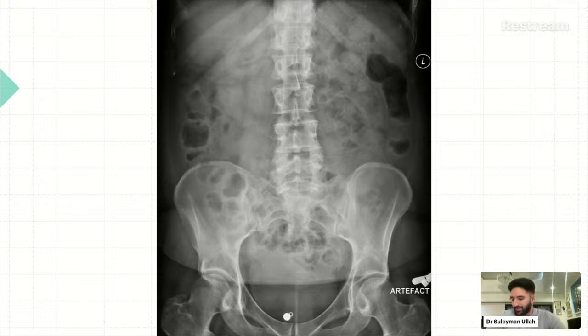There is no, the cecal region looks edematous, I think. It'd be hard to spot that on an X-ray, I'll be honest. Edema on an abdominal X-ray. But I can see why you've said that though.